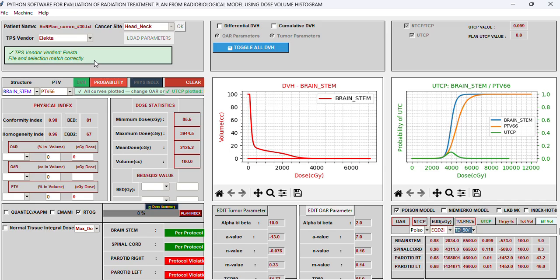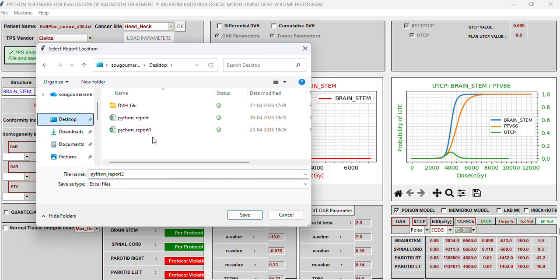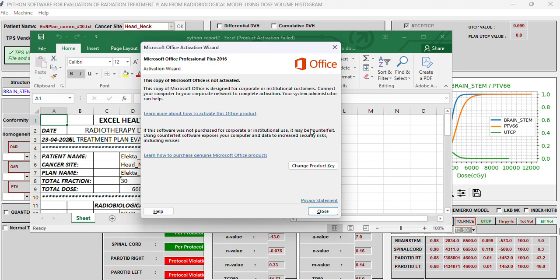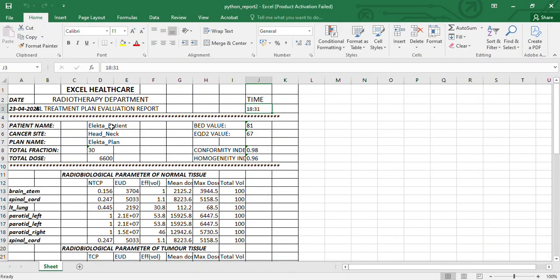the result generated. So likewise, here the file, we can print the report, and we can save the data to desktop as V2. The data has been stored. Again, it will be shown here. You have to open here. Open here. Same thing. You can see the time, date, the patient name.